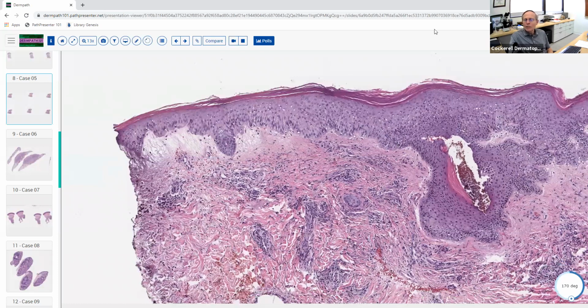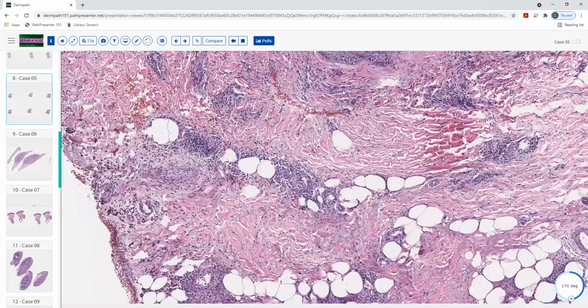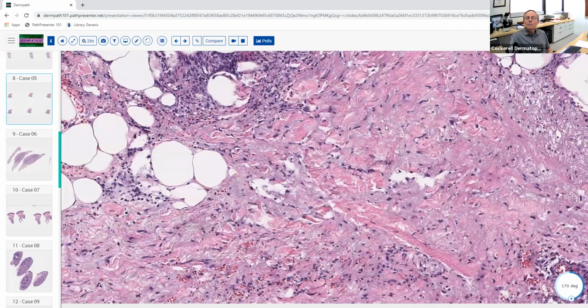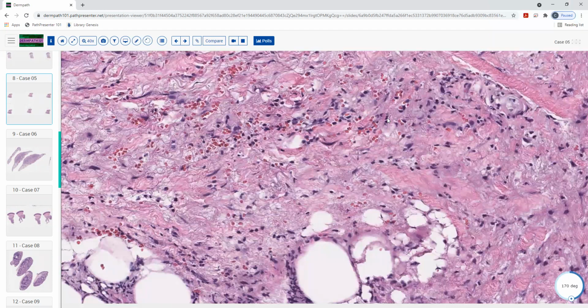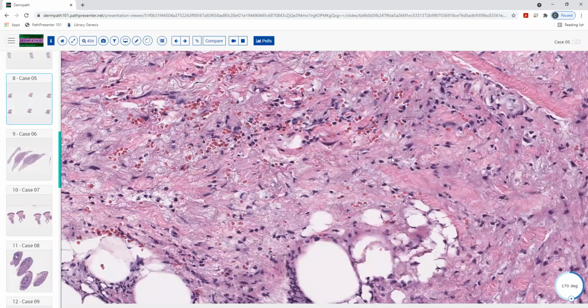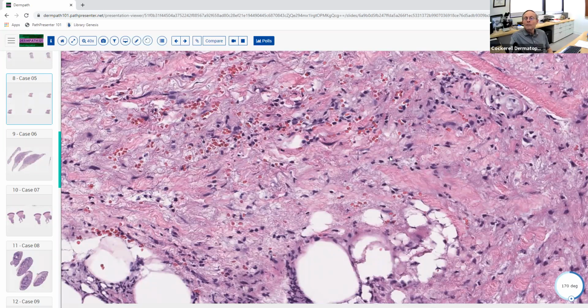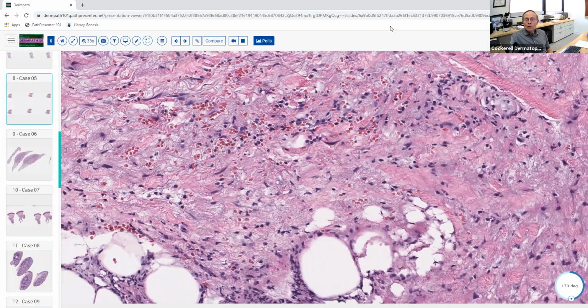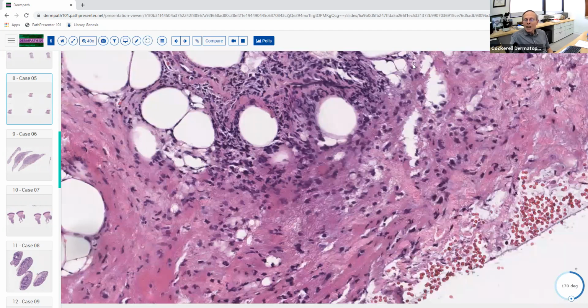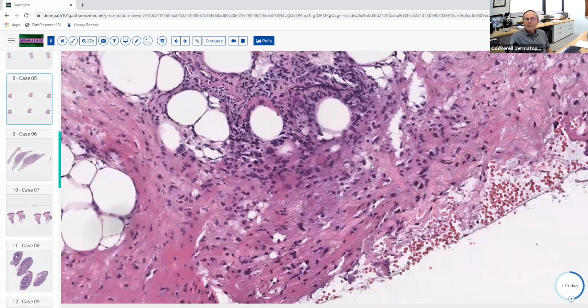And what kind of cells were in the infiltrate? From this power, I guess we can see probably some lymphocytes. There are some lymphocytes, but there are also some of these cells in here. Looks like eosinophils. I think most of those are extravasated red blood cells. Yeah, red blood cells. But these cells that have two lobes to them, probably some neutrophils. So you've got a diffuse infiltrate, mostly interstitial. Look at these neutrophils over here. Polys with papillary dermal edema.